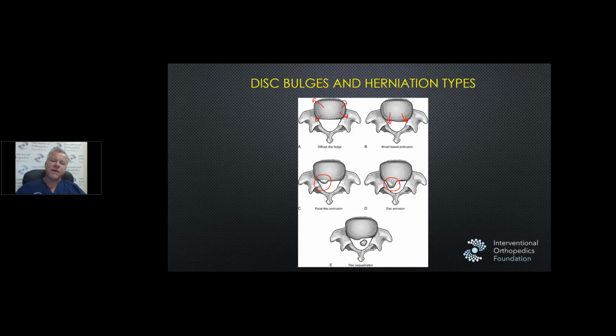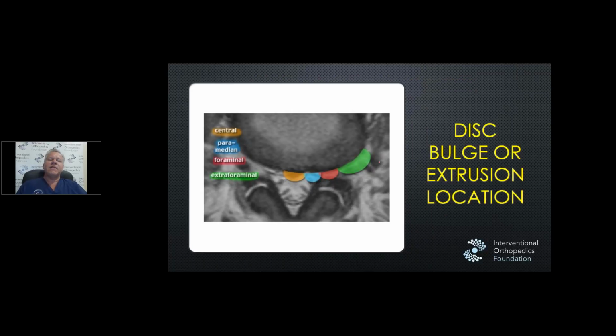The actual definition of this is that this length gets to be more than that length. So basically the anterior-posterior length gets to be more than the medial-lateral length, and it's officially a herniated or extruded disc. And then there's a sequestered disc, where a piece of the disc material goes into the canal. Obviously, you can name all of these based on where they are.